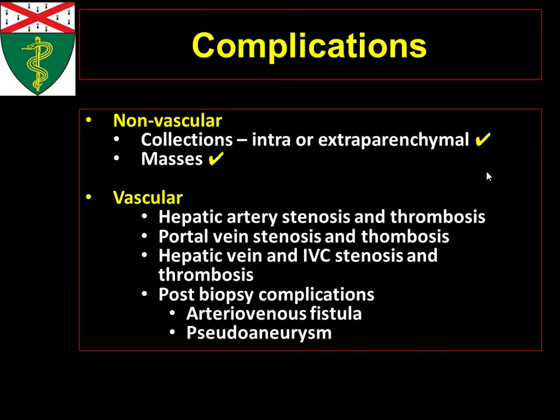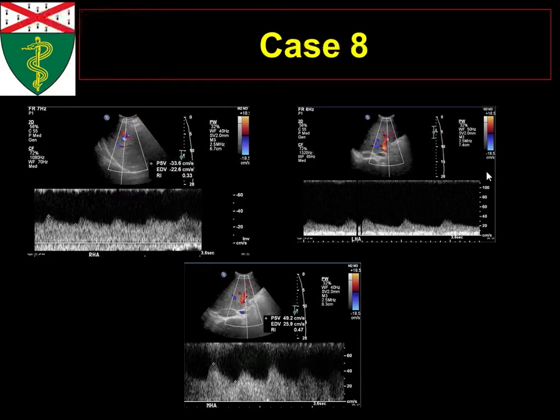And that's kind of it from my perspective for non-vascular complications that I look at. I look for collections, I look for masses, and that's about it. And then I go to the vascular complications. So here we go. The fun stuff. What do you think is going on here, guys?